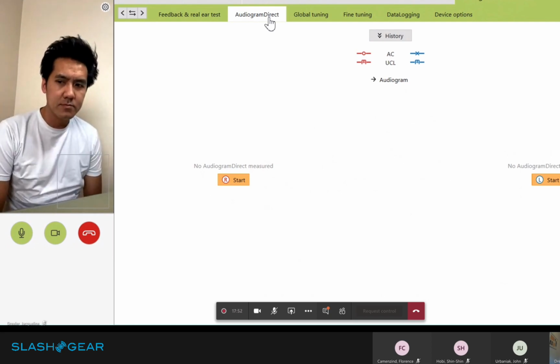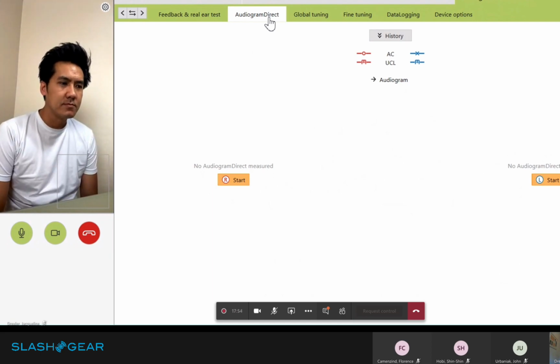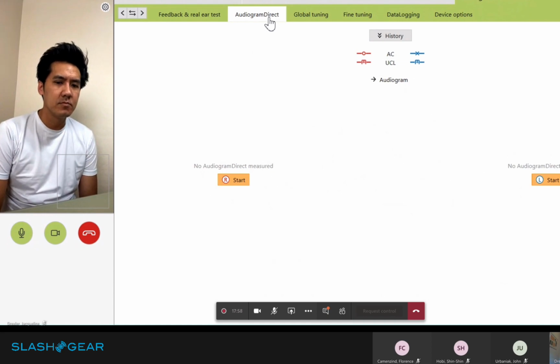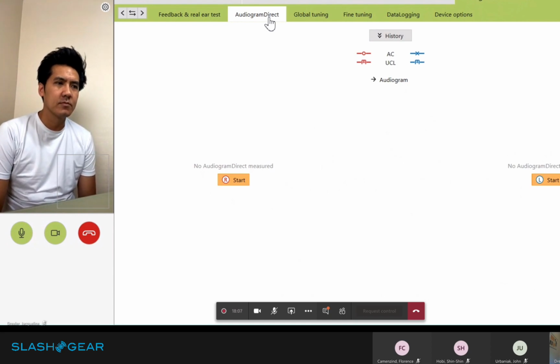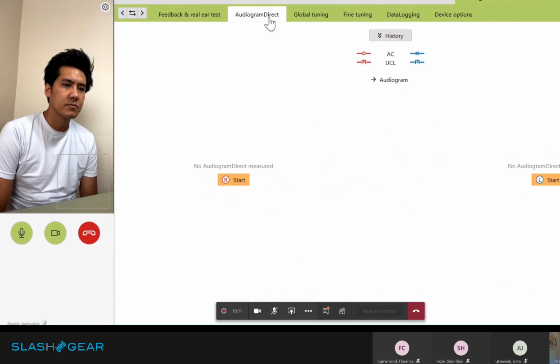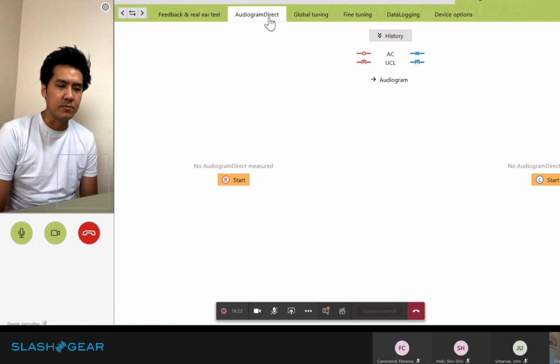So when you go into a clinic, you have a full diagnostic battery, with the headphones or the insert earphones. Now what this is doing is just taking that information, that full diagnostic test battery, but now you have the hearing aids, so it's a baseline for the hearing aid fitting. And now you have the hearing aids, so we can check the whole system with the earpiece on and with the acoustic coupling, the venting, the insertion depth.